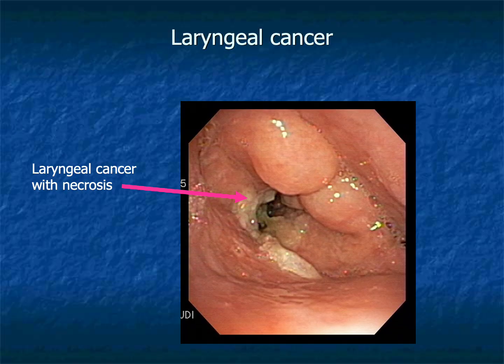This image demonstrates laryngeal cancer with areas of necrosis. Malignant lesions often display irregularity, tissue destruction, friability, and distortion of normal architecture. Even in still images, one can appreciate the loss of normal symmetry and the invasive character of the process. For patients, lesions in this region carry consequences beyond airway compromise. Voice, swallowing, communication, identity, and quality of life may all be affected. The larynx is both an airway structure and a human structure.